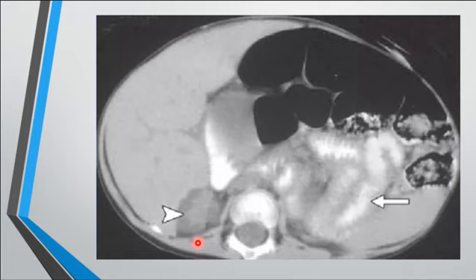Kidney. Yes. And what does this kidney look like? Atrophic, hypodense. So, I'm giving you a history of chronic renal disease. This was a case of hypoproteinemia and chronic renal failure. So the patient is edematous. The bowel wall is edematous due to the renal failure, not due to an abnormality in the bowel itself.